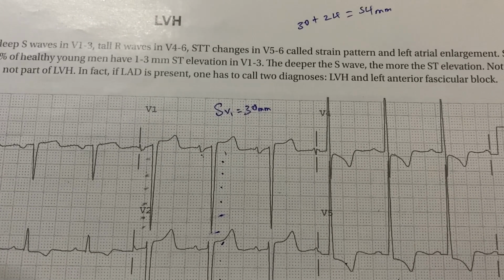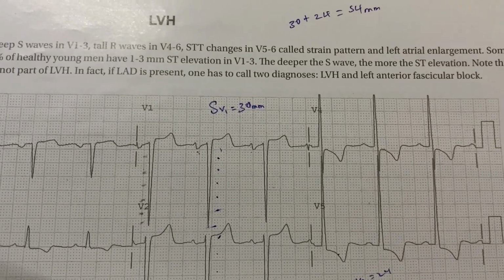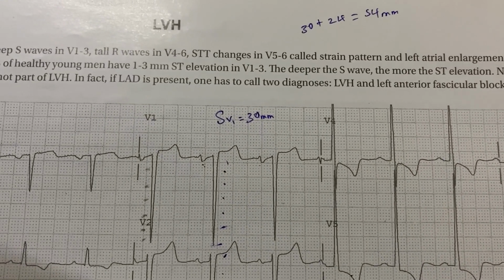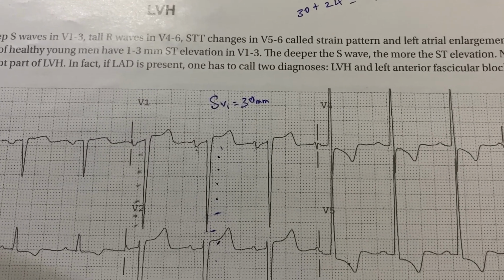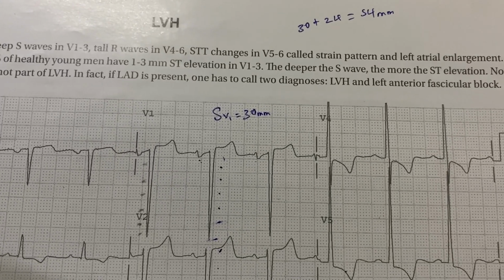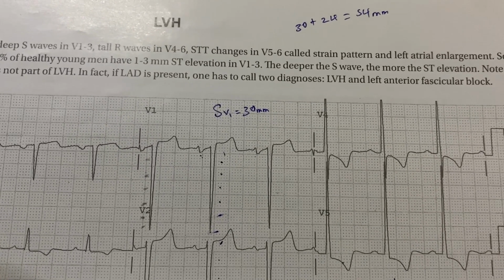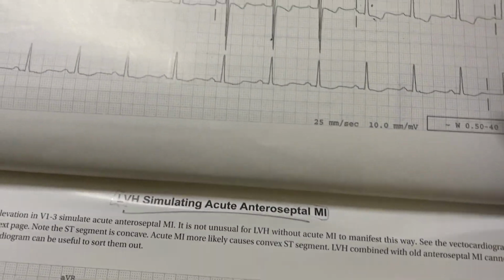If there is no fascicular block, then the patient may have a horizontal heart, a very short stature, or an obese patient where the heart is horizontal. So there it can produce left axis deviation. Otherwise, it has to be a fascicular block. And the next topic will be conduction defects. So fascicular blocks will come.